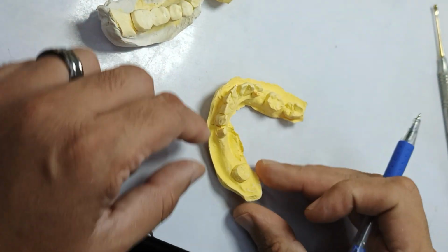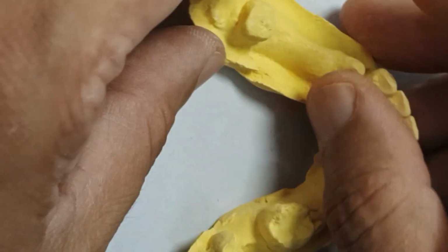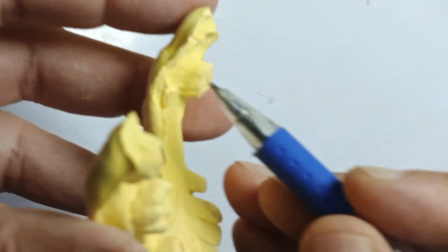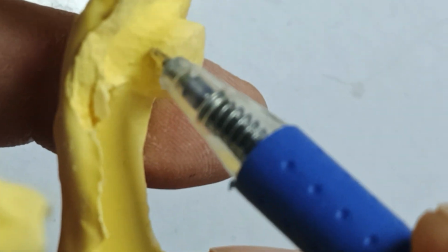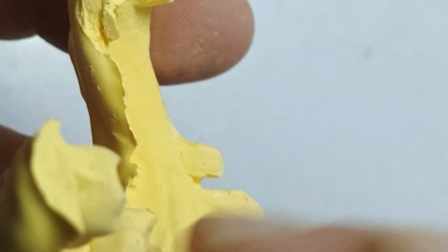Look at this one. I'm just picking it up. What is this? Look at how it is cut. Where is the draw? There's an undercut right there. Can you see any margin? Get closer, please. This is where the impression material alginate got pulled. Hardly anybody is giving vinyl polysiloxane. Everything is an alginate. Look at this one.